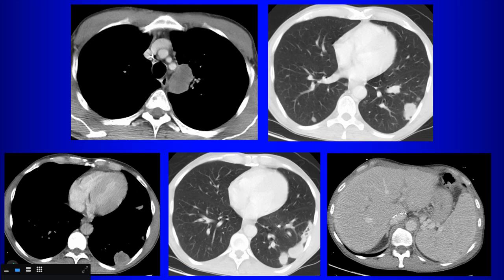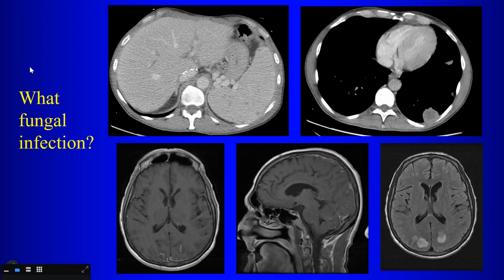Liver transplant. Look, that stuff around the IVC, this patient has had a liver transplant, okay? What does that tell us about the patient? Immunocompromised, right? So this means now all bets are off. There are a lot of crazy things we have to start thinking about here, right? So what else happens? Well, this happens. So what do we see on the MR?